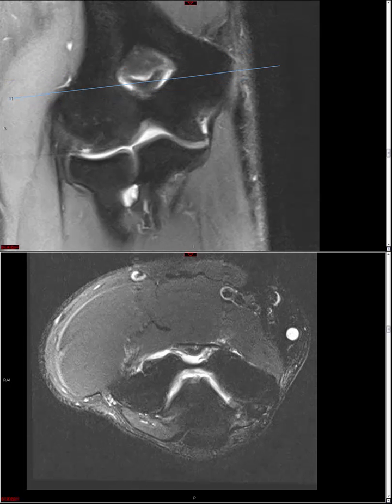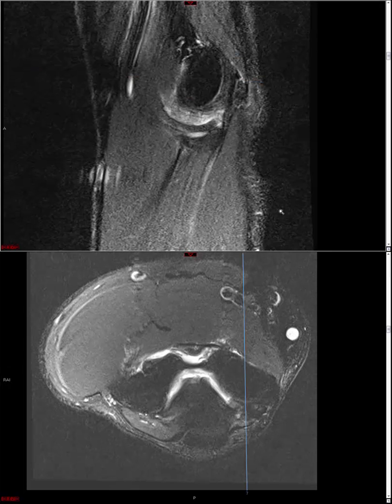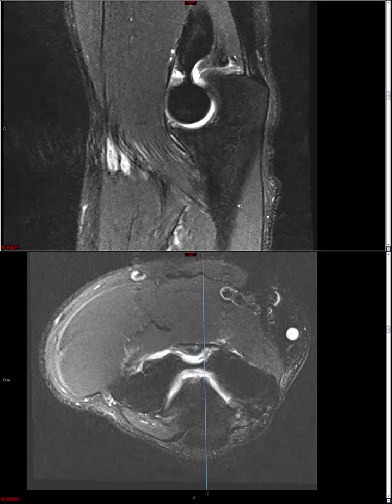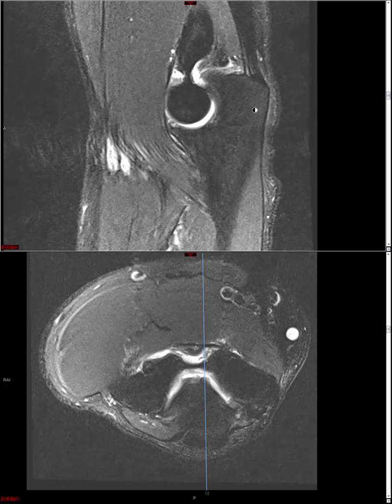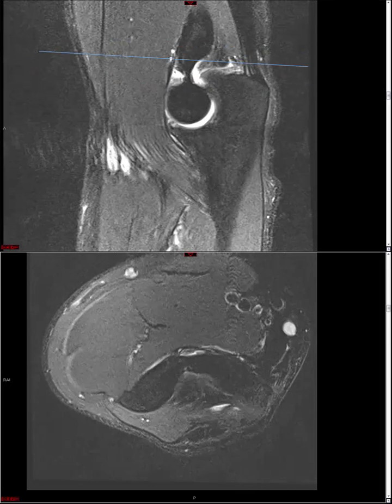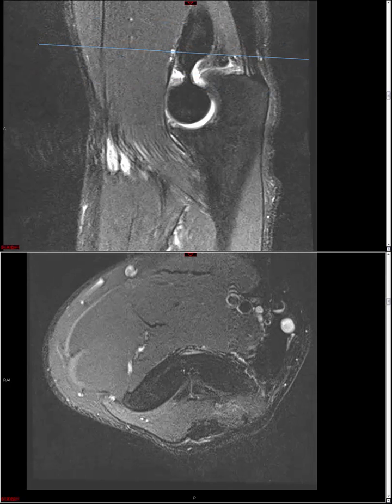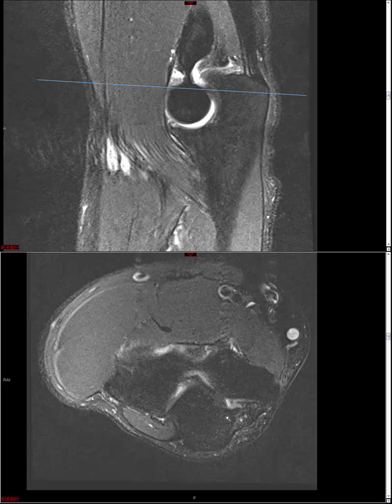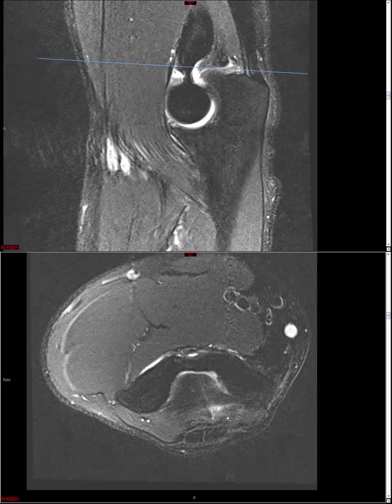and then finally the triceps tendon, which looks a bit like a quadriceps tendon. So let's just pull up the sagittal here, and note that the triceps tendon also has a somewhat striated insertion, very analogous to the quadriceps tendon. So try to appreciate this striated appearance as you start to look at more elbow MRIs, so that you can develop in your mind a normal database of how much increased signal in this location is acceptable.